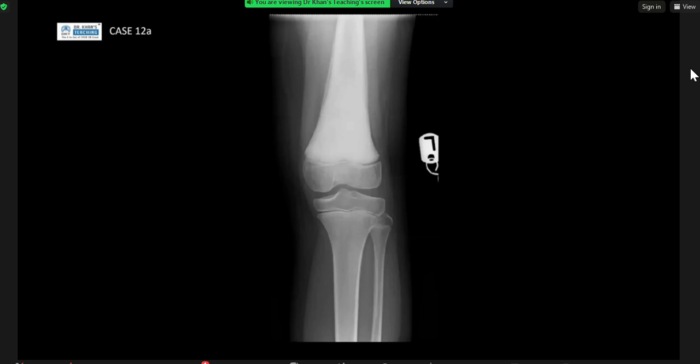So based on this sclerosis of the metadiaphyseal region, my differentials would be. Before you get to differentials, can I stop you and just think about whether you can see any aggressive or non-aggressive features? I'm not able to differentiate whether this is a lucency beneath cortex or a periosteal reaction. So I would say it is a periosteal reaction and attribute towards the aggressive feature of the lesion. Okay. Is there anything that you would like to know about this patient before you give a differential? Perhaps lab parameters would help. Biochemical values of phosphate, calcium, or lead toxicity.